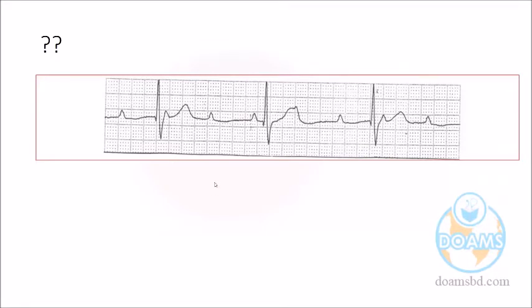Sir, third degree heart block. Complete heart block, yes. Is visible. What is the heart rate? It would be 35, around 40. Around 40. So this is a very simple clue, doctor. Heart rate around 40, check for complete heart block, then you will be able to prove it.